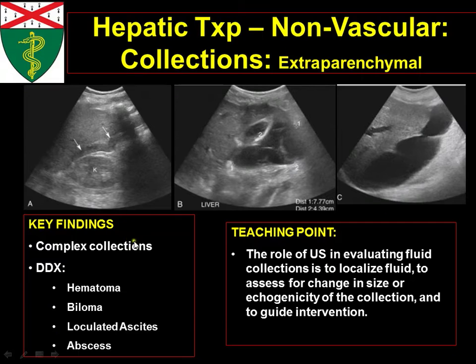It turns out that most of these things will look pretty similar on ultrasound. There's no way we can tell the contents of something on ultrasound. Anyone who asks us to do so, that's ridiculous. We can't do that. But what's ultrasound useful for? Ultrasound is useful for following these collections.